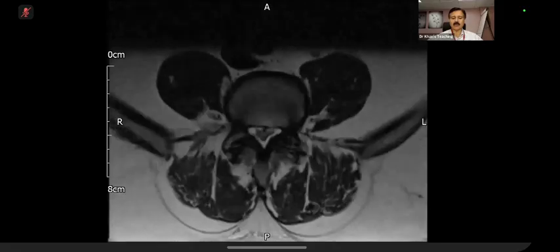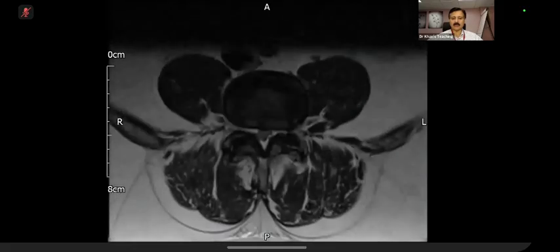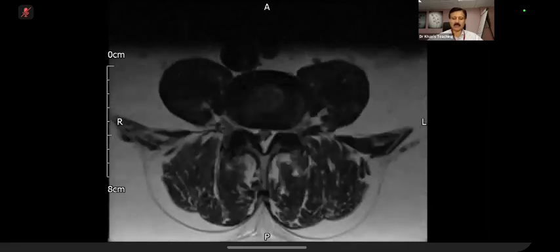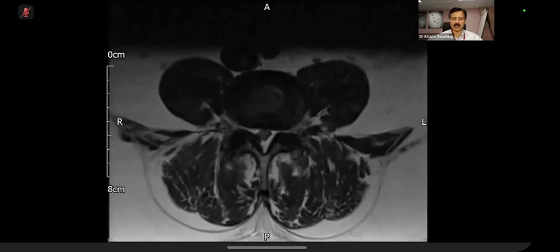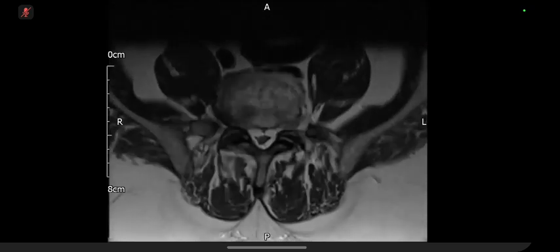So this is a potential long case. The bar in the exam is going up and up. This case has not come in the exam, but it can come in the exam. And please remember, part of my endeavor was to help you develop your eyes for the different signals and things like that. That is why I have selected this case.